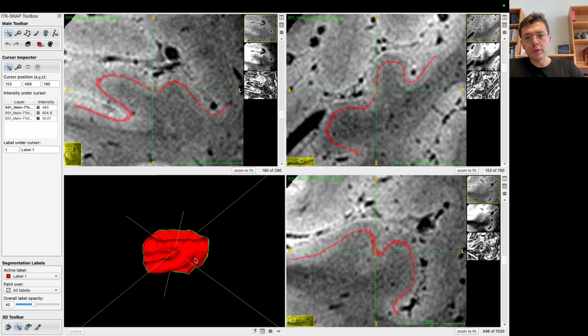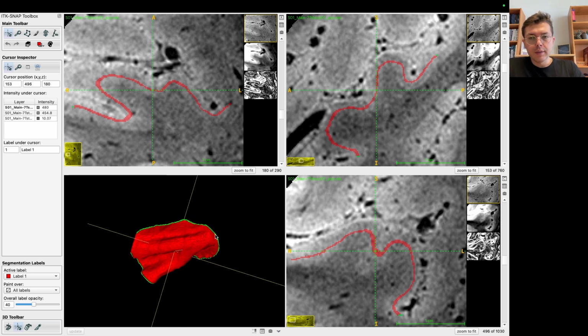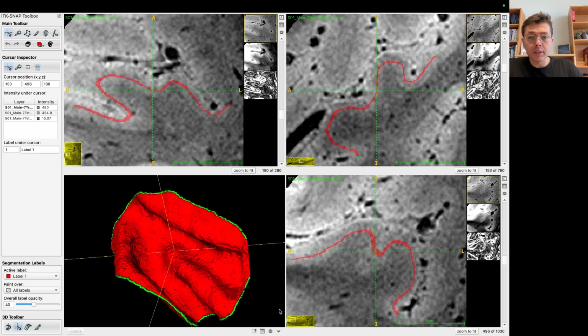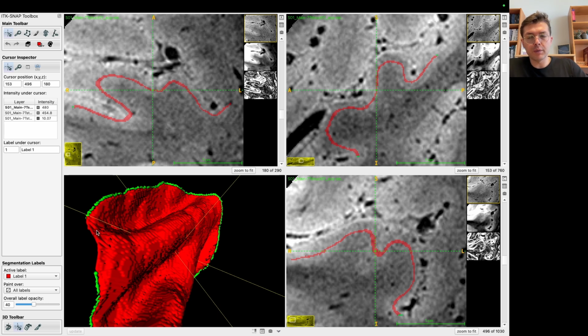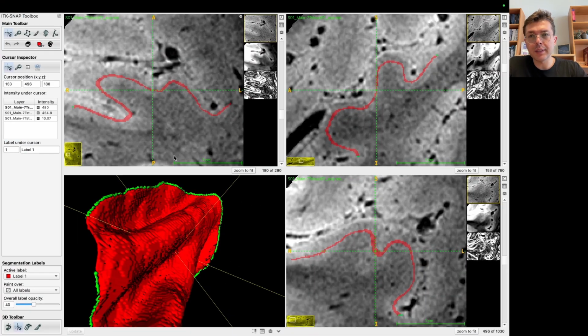Okay. So the important thing here to check for quality control is that this green border should be continuous, which means without interruptions. Like for instance here, see, we hit a boundary, which means that we need to extend our segmentation a little bit in that direction for this 15 millimeter radius disk to fit.